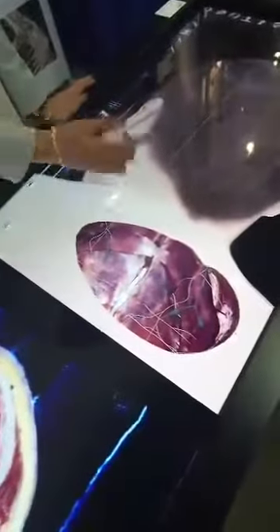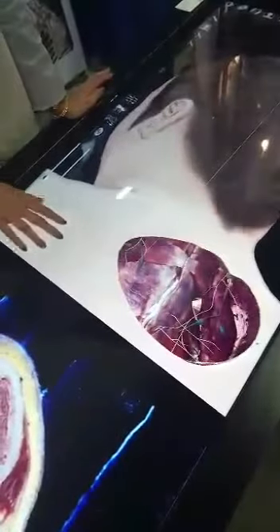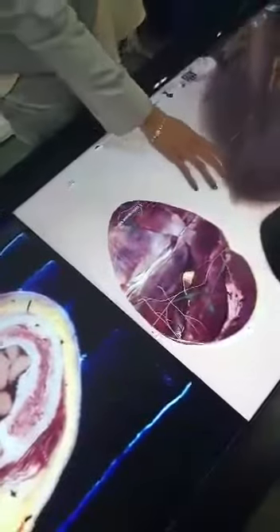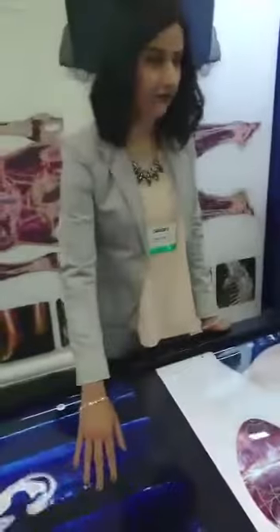To mimic something that you'd find in surgery, you can also do natural cuts. So in this case, I have an incision made, and you can also see the relationship between the skin, the fat, and other structures. And as I showed earlier, you can go ahead and also remove structures here and press this undo button. And what's interesting is these are actually the scans that were done from the cadaver.